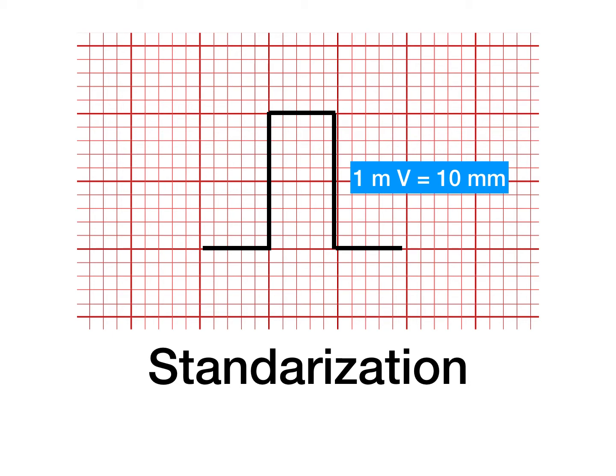You have to find this sign that is located to the left side of the ECG, and it should measure 1 millivolt or 10 millimeters in height. If that is not present, you have to make sure to standardize it, because then you might miss hypertrophy of a chamber, or you can overdiagnose it. Okay, so important, make sure that the ECG is standardized to 1 millivolt of height.